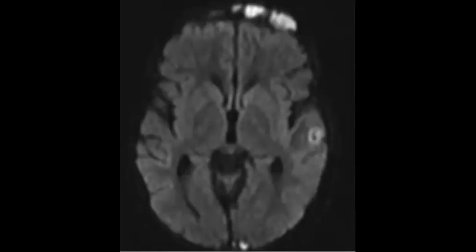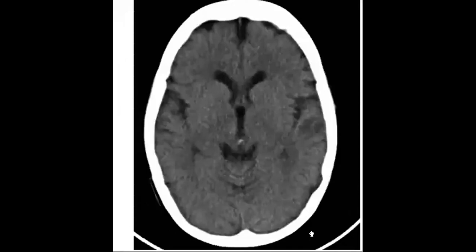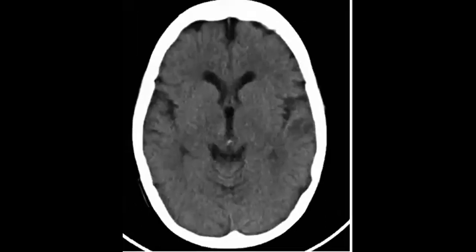Also in the non-contrast CT, you can find signs that tell you whether there is any hemorrhage or not. But in this case, we don't have any. So likely this patient has just these abscesses, as we saw in the post-contrast MRI. Okay.